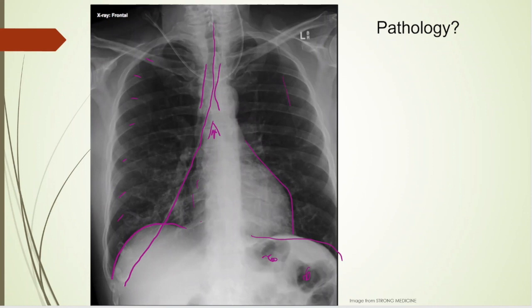This is scapula. Don't mistake that for pneumothorax. And I had the advantage to be able to use my iPad to make this image larger because it's difficult to see, but there are lung markings out there, even though it's difficult to see here. If you have an iPad, you can make this bigger and see those markings as well. Just have to take my word for it. So pathology here looks like they have an NG tube down in the right lung and needs to be replaced.